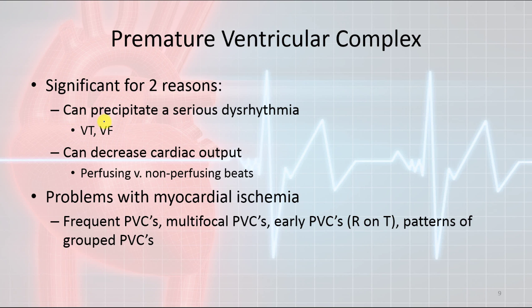Number 1, they can precipitate a serious dysrhythmia. This is VTAC, that's VFib. If you're not familiar with those abbreviations, those are common abbreviations. Another problem with a PVC is that it can decrease cardiac output.